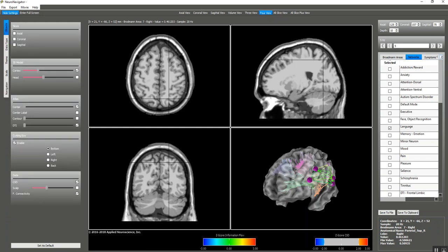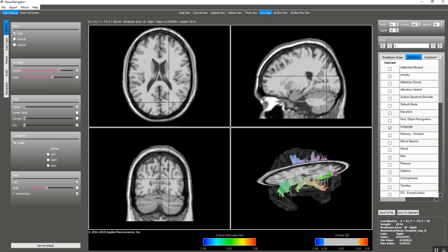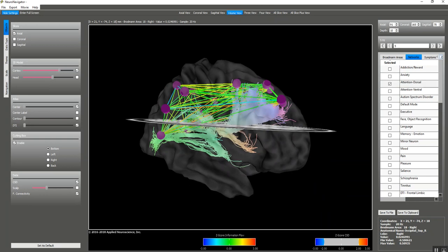If we come back up here, we can look at the connectivity by selecting connectivity and then the center voxel, which we've done, and making these various other images transparent or not allows you to see in greater detail the various aspects of the brain that you may be interested in to link the patient's symptoms to the patient's brain and dysregulation in the patient's brain. So I'm going to look at the attention network, which is deviant from normal, and at least this patient's symptoms are ones in which there are serious problems with attention.